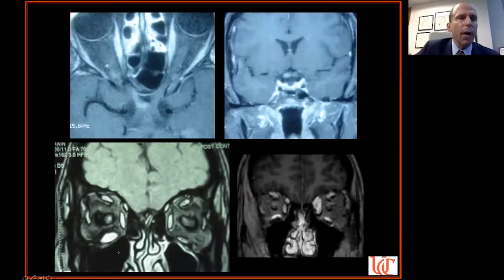muscle. Thyroid eye disease. And here's a patient with double vision, known, I think this was colon cancer, thought not to be metastasized, with this giant, in my opinion, orbital lesion, actually a metastasis. Here's the superior oblique muscle right here. Here's the met to the superior oblique muscle. Here's the normal medial rectus right down here. But this was a metastasis to the superior oblique muscle causing the double vision.